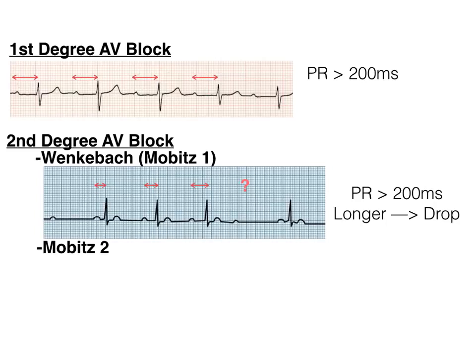Okay? So what you're looking for in Wenckebach block, again, the PR intervals are still greater than 200 milliseconds because they're prolonged, but you're getting PR intervals that are progressively elongated before a beat is dropped. That is Wenckebach block. Another way to remember this is some people say Wenckebach gives you warning. Just think of those W's. Wenckebach gives you warning. The PR intervals are gradually lengthening and they're warning you, yo man, I'm about to drop a beat. Check out my EKG. That's Wenckebach block. That's also known as Mobitz Type 1.